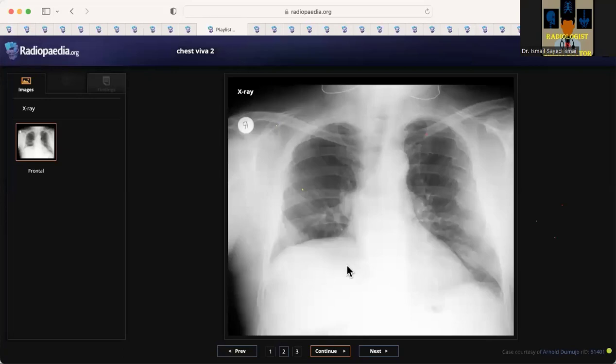So I wanted you to describe that as a raised hemidiaphragm, and I wanted you to go and look at the ribs. There are no surgical clips, no evidence of thoracotomy to indicate that this patient had a previous lobectomy. Other causes, I would think of phrenic nerve palsy, or it could be diaphragmatic eventration. I'd like to compare to previous images and see if that's been chronically present or not. And then I'd be thinking of other abdominal causes. Okay, so that's just a raised hemidiaphragm.